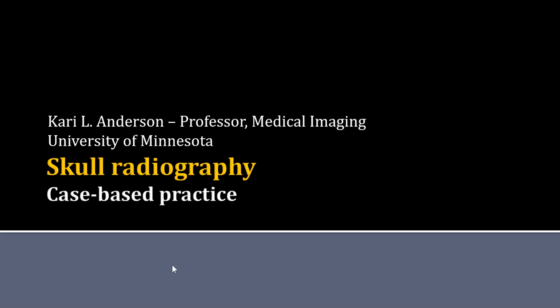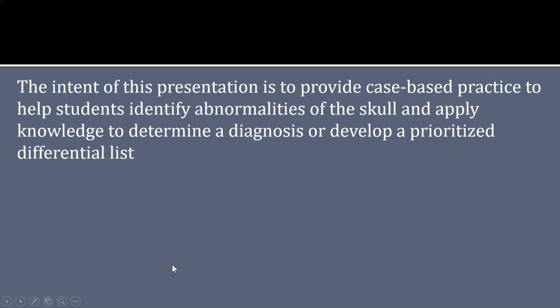This is the last in a series of presentations on radiography of the skull in veterinary patients. The intent of this last presentation is to provide case-based practice to help you identify abnormalities of the skull and apply the knowledge you've learned to determine a diagnosis or develop a prioritized differential list.